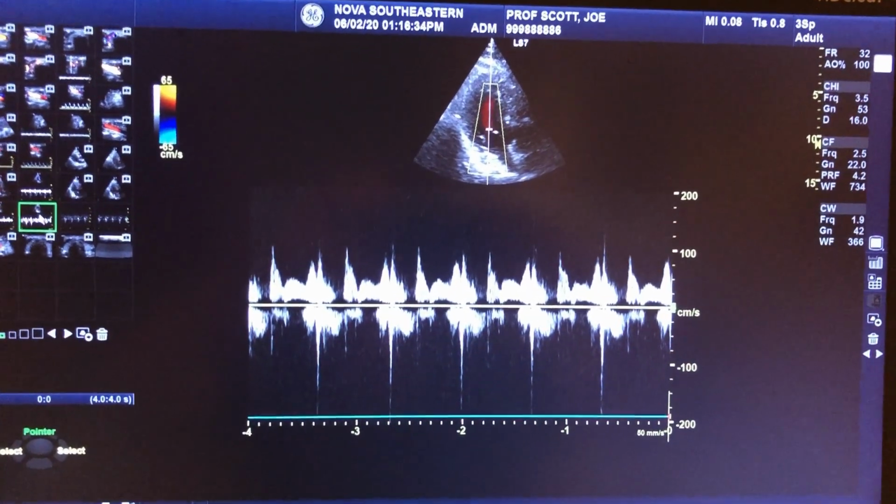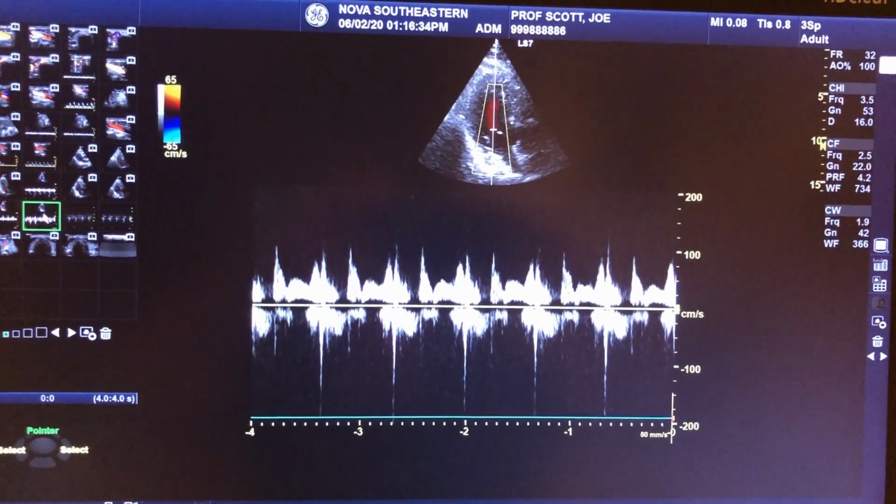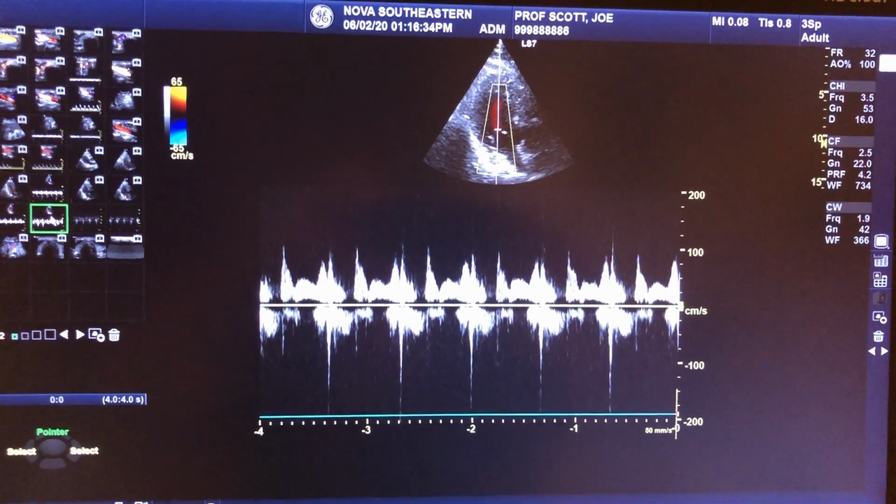Usually in cardiac, when you have high velocity flow, you also use the Pedoff probe. The Pedoff probe is a non-imaging continuous wave transducer. It has two crystals, one for transmitting and one for receiving. I have no idea what Pedoff means.